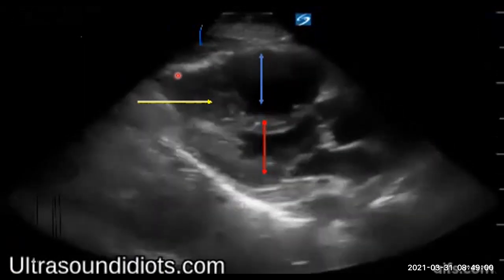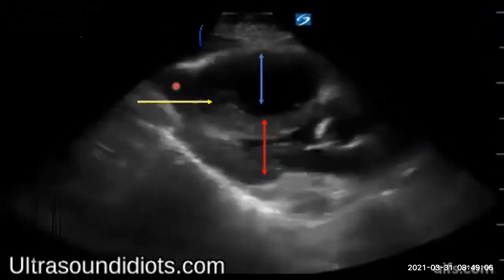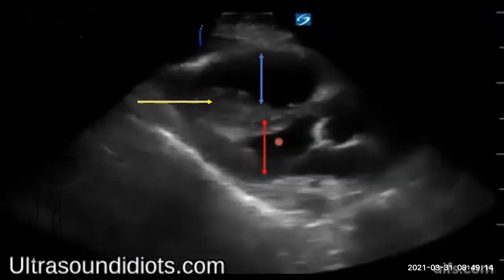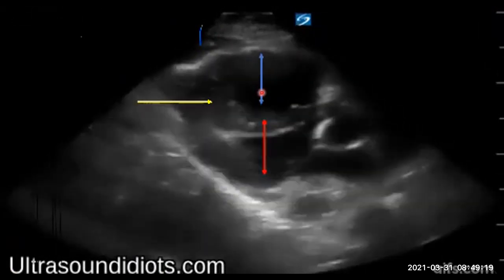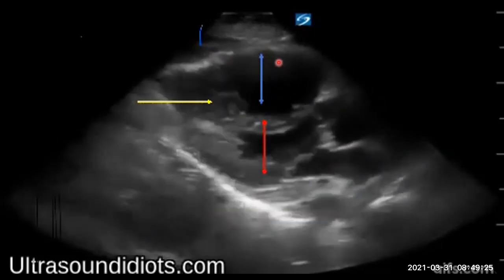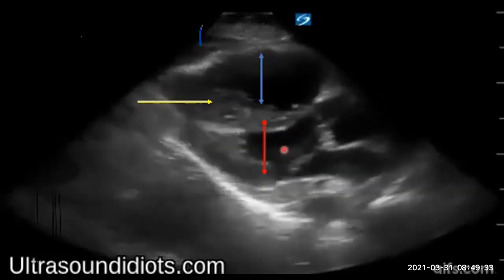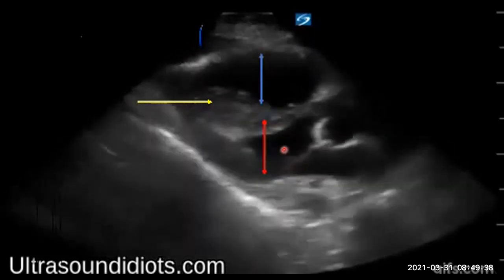Number two, you don't get just this apex that's functioning, because it's not an acute thing. It's not an acute stretch. So you get this patient with an entirely functional right ventricle that's able to keep on pushing through, all right? However, you do still get a collapsing left ventricle. You do still get a collapsing left atrium. And that's one of the harder things to differentiate, because if you're not sure how to look at the two, all right? Now, when you get that, you have this big hypertrophied right ventricle and a very collapsed left ventricle. That's a sign of pulmonary arterial hypertension, all right? Which Viagra was created to treat, by the way. That was the whole point of creating Viagra, to treat that problem, okay?